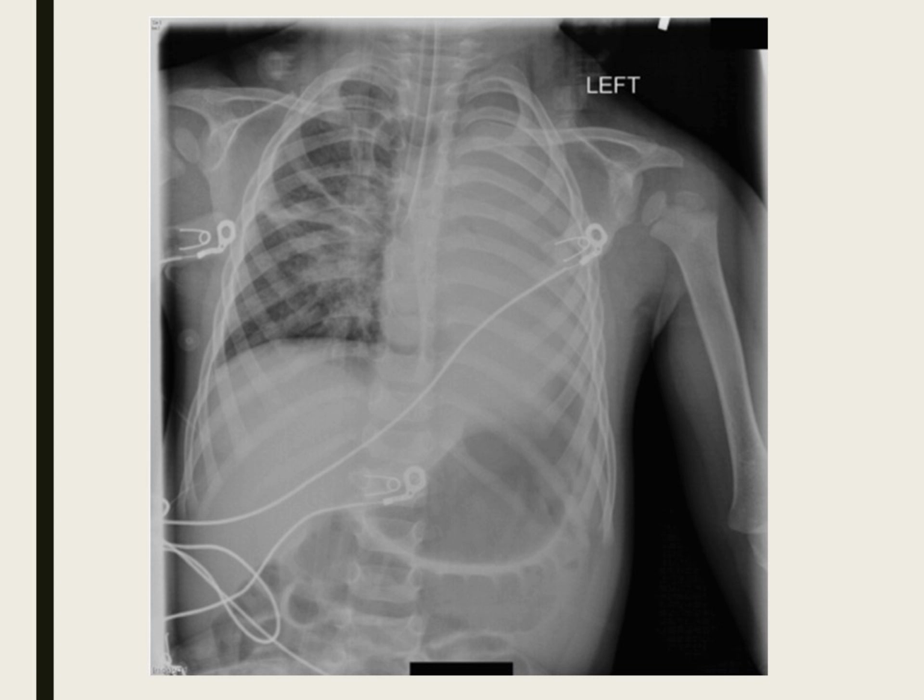Because you don't see the cardiac silhouette and it should be sticking out. The heart should be sticking up a little to the side like in the other films, right? It doesn't. So you can sort of guess that maybe it's slightly shifted to the left, because the left lung is sort of collapsed. It's sucked in. Why is it sucked in? Well, let's look at that.